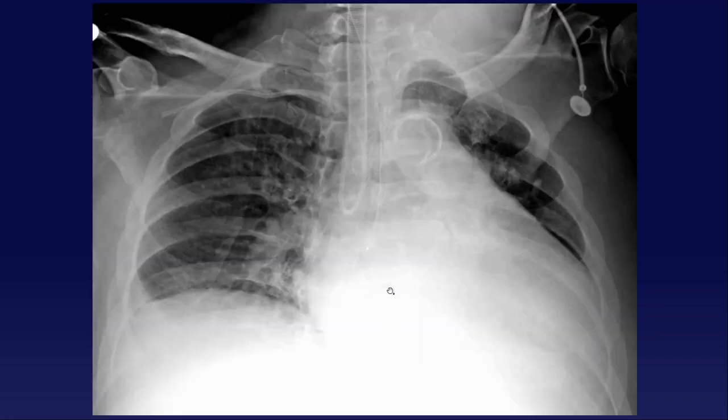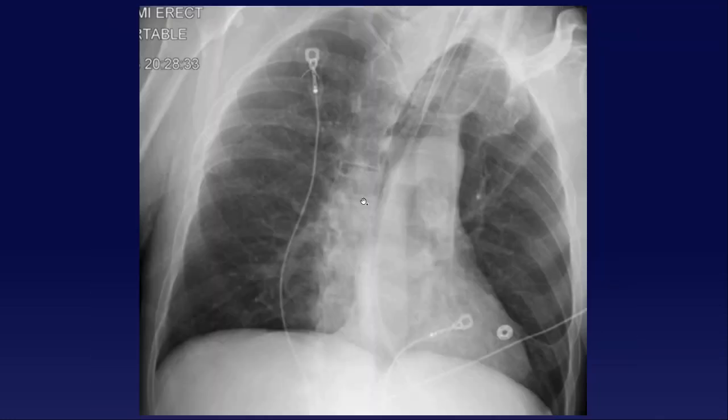Okay, how about this one? It's doing a loop-de-loop, making a U-turn in the superior vena cava, and its tip's probably poking back up into the right innominate vein. How about this one here? Central catheter coming down, crossing midline, tip crossing over into the contralateral right innominate vein. So basically this one's making a U-turn going up on the opposite side.